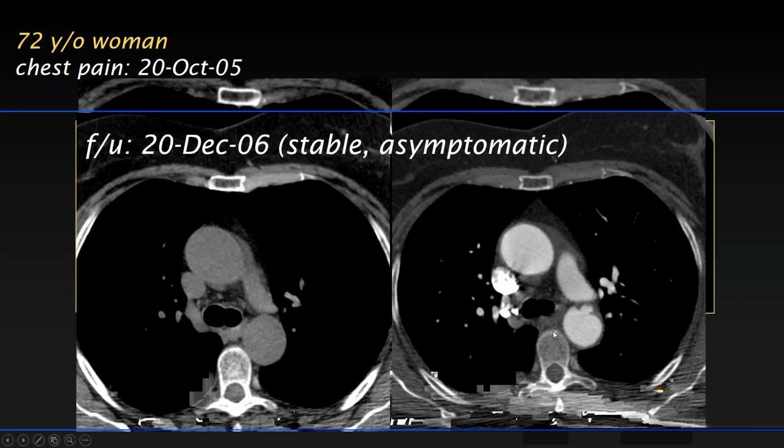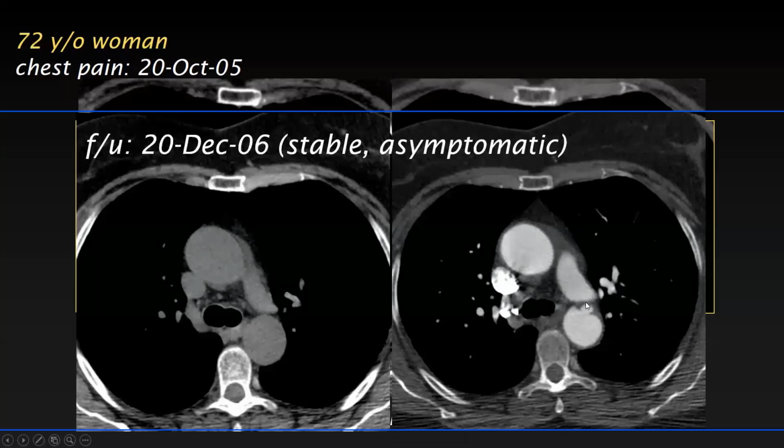On the images, I do see a lesion that looks like an ulcer, right? This looks like an ulcer here, clearly, as it can be. The question is, does this patient now have an acute penetrating atherosclerotic ulcer? And the answer is no, the patient doesn't. The patient has an ulcer-like lesion. The patient does not have any symptoms. The patient is asymptomatic and has no intramural hematoma.